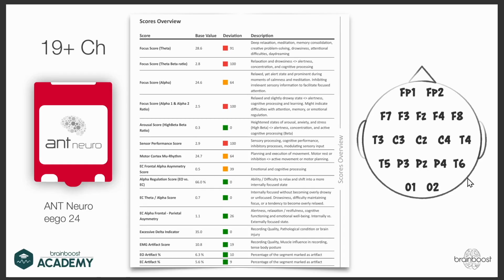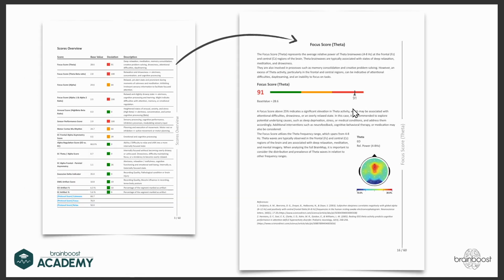Sorry, and then I'll stop talking. This was also just a very short recording. But if something is maxed out on the scale, so 100, it looks scary. If the scale goes from 0 to X and you exceed that limit, of course, it will look red and 100. So sometimes it can look a little extreme. But it's a report that should show and will display data. So it will just give you info, period.